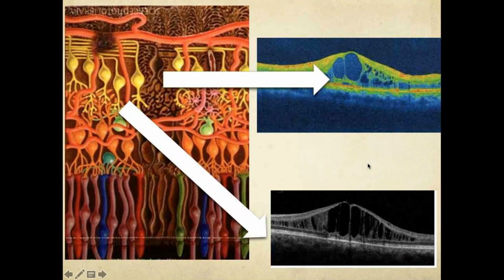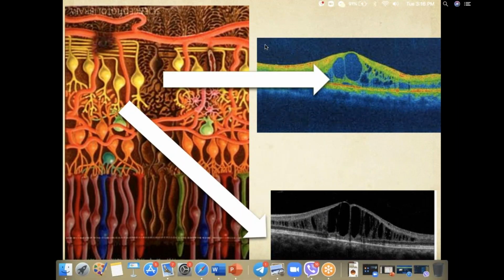So this image, why I have mentioned it is, if these are the photoreceptor layers, these are the nuclear layers. Then you have the connections. The connections are the plexiform layers.